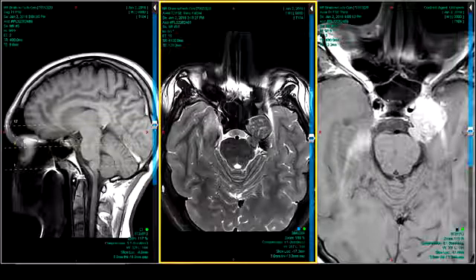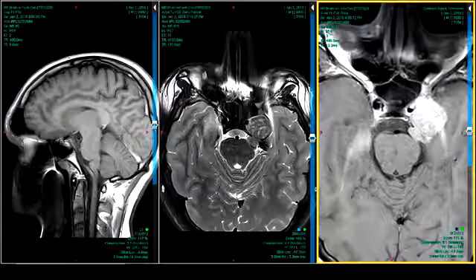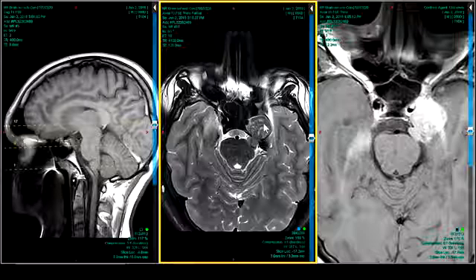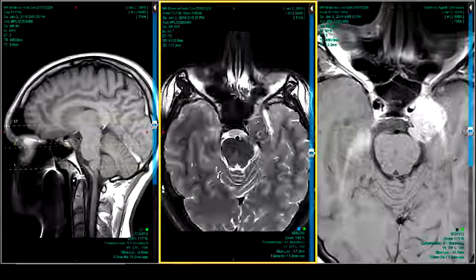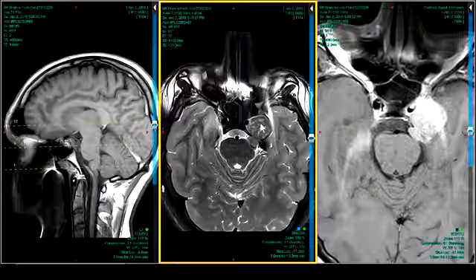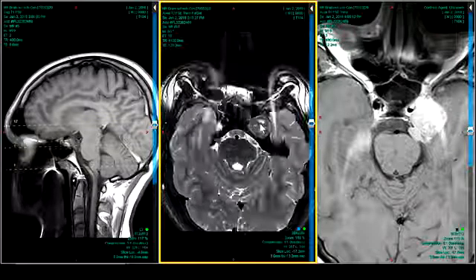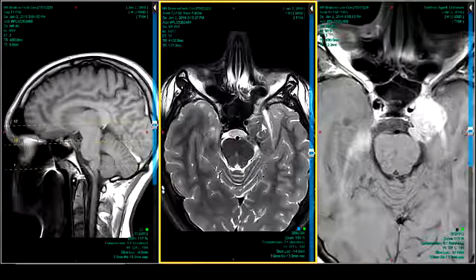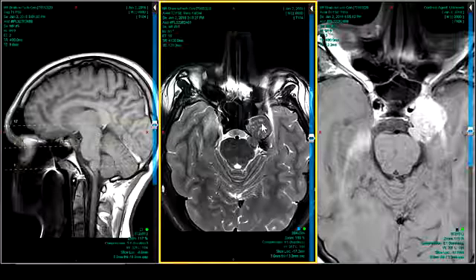Then we might look at the vascularity. Well, it's very vascular, somewhat homogeneously vascular, and it happens to also be encasing or at least encroaching on the left carotid artery. Next, the signal, well, it's mostly intermediate to lowish in signal with some internal kind of speckled high signal, and that's good for most solid desmoplastic and or fibrous lesions. So that would fit pretty well with this particular diagnosis.